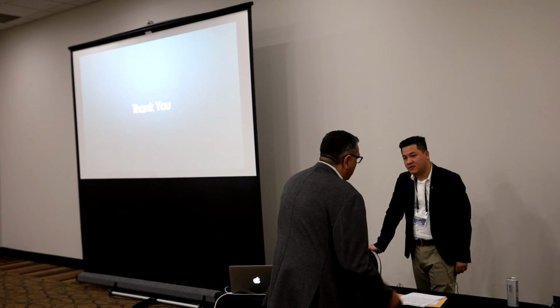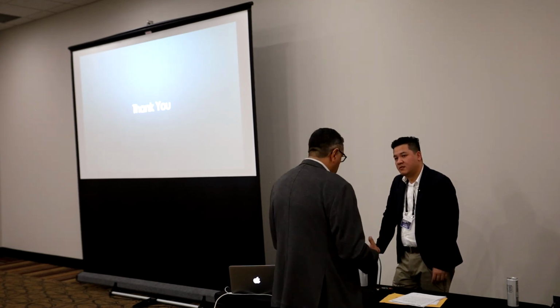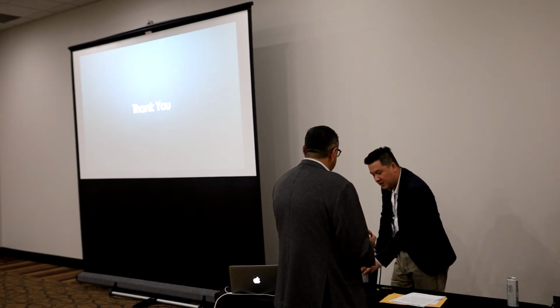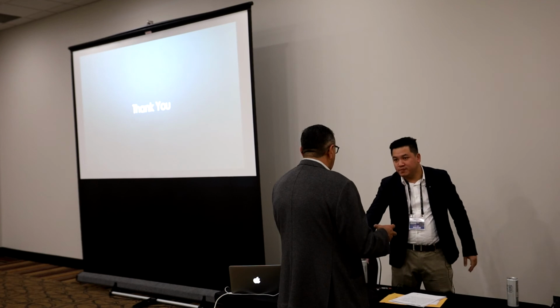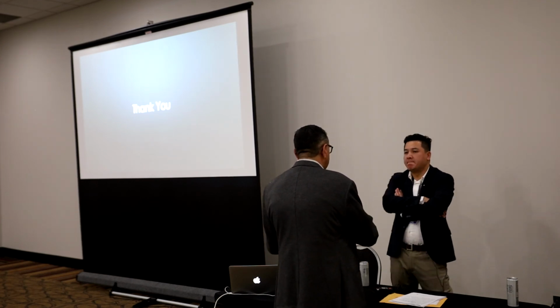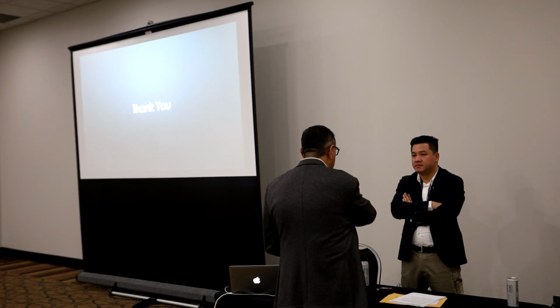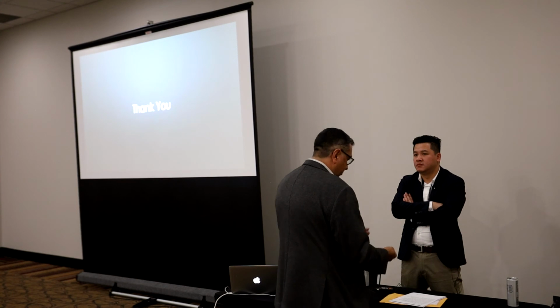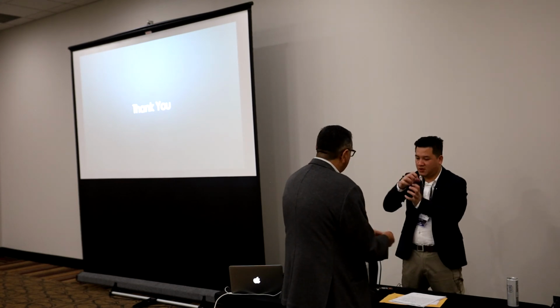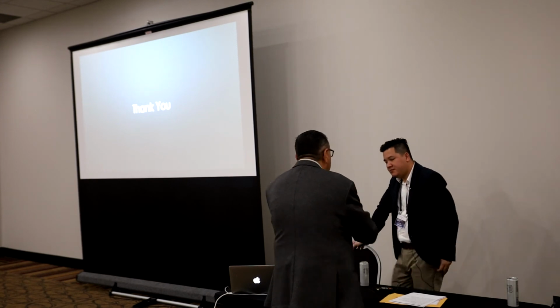We have printed, and then this is what we get, the model. He does it on-site. We articulate the models, open the bite 2 millimeters, and then scan the models. Instead, he does the virtual articulator on-site, and then we design the guard, it comes out of the printer, and it fits in the model. When you close it, it's open in the back or in the front, one or the other, depending on whatever they want. And then there's the grind.